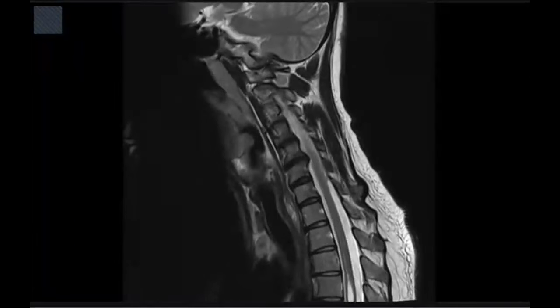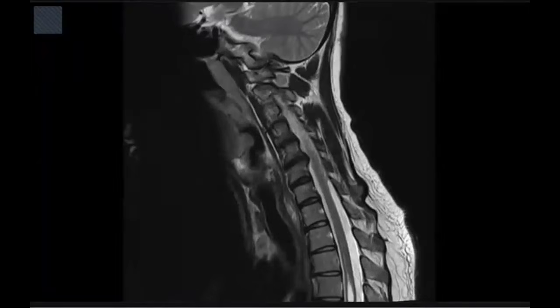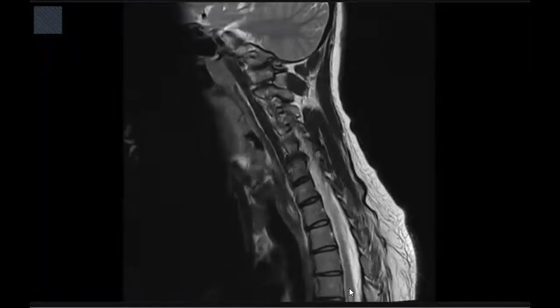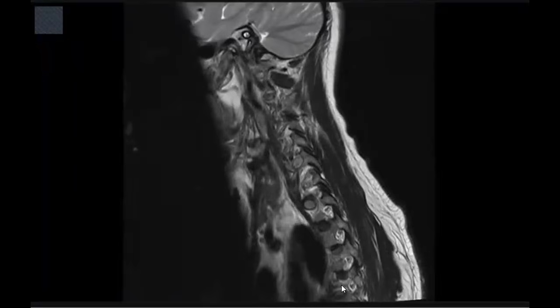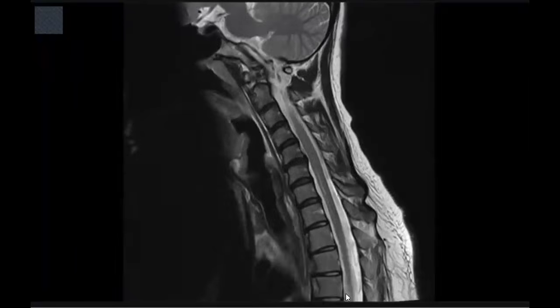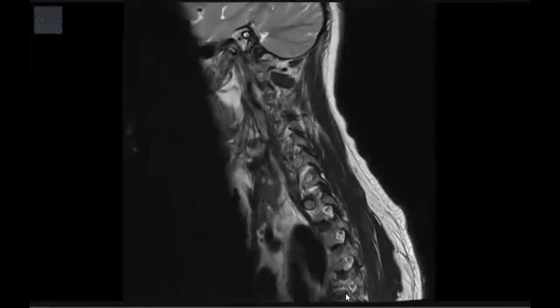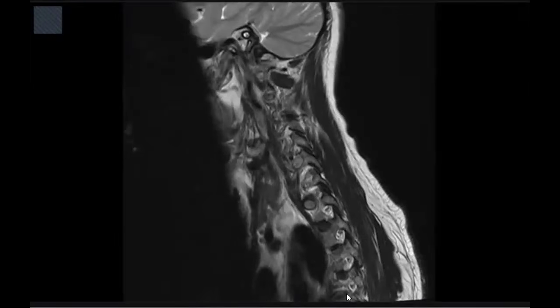All right, on the T2 weighted images, I can see that there is an area of hyperintense signal intensity noted in the visualized mid-thoracic cord. I can see its proximal extent, its distal extent is not shown here. Is it intramedullary? Is it mid-thoracic area? Yeah, this is mid-thoracic area. It is seen starting from this mid-thoracic region. And I want to see the distal aspect of the lesion, if there are any available cuts in the lower thoracolumbar spine, the lumbosacral spine.